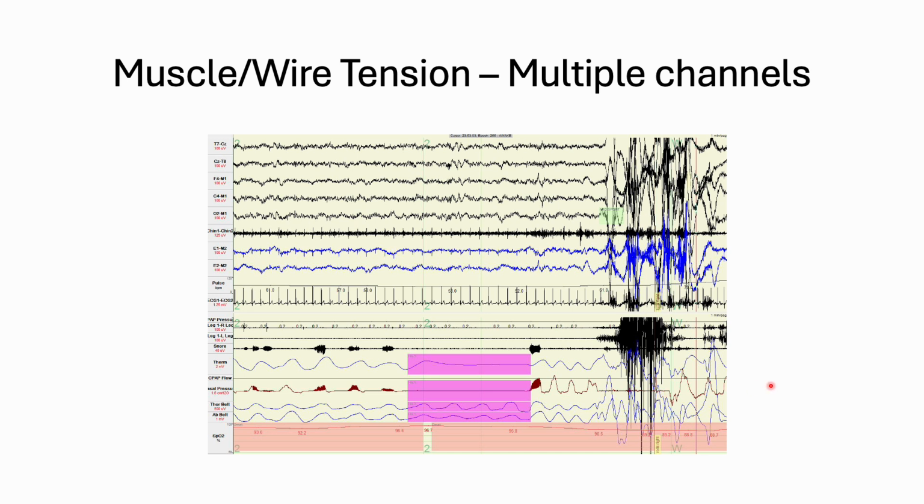No one really told me this stuff. What's happening here? No air, but they're moving around and they're flexing their muscles. So it looks like they're holding their breath while they move. If you just think about the things that you're looking at and what do you think you would have to do with this equipment on to make a signal look like that?